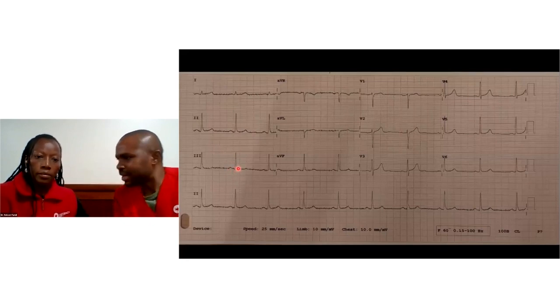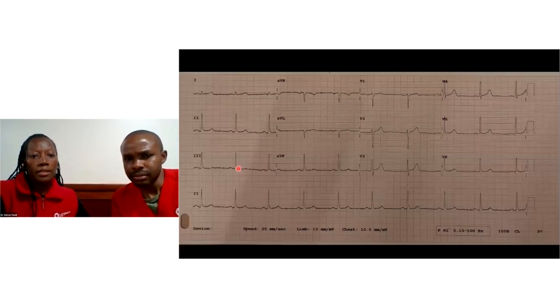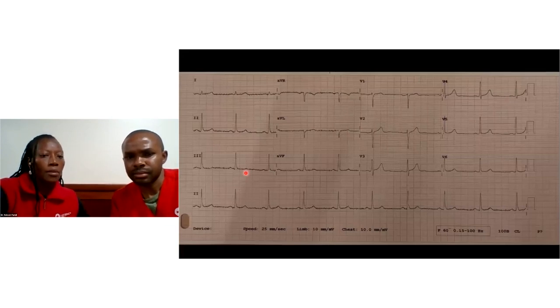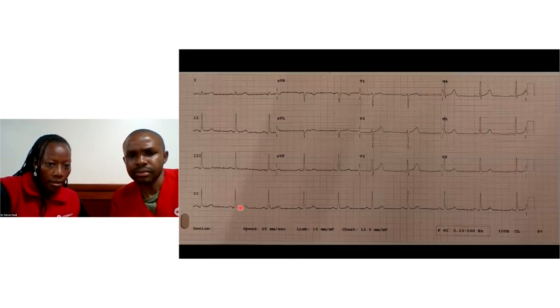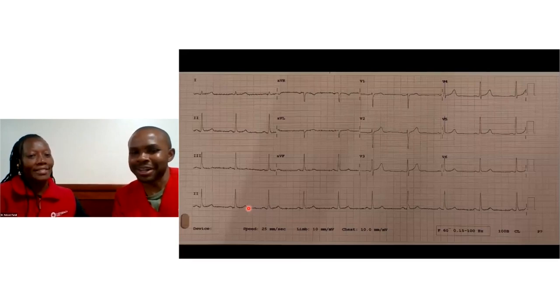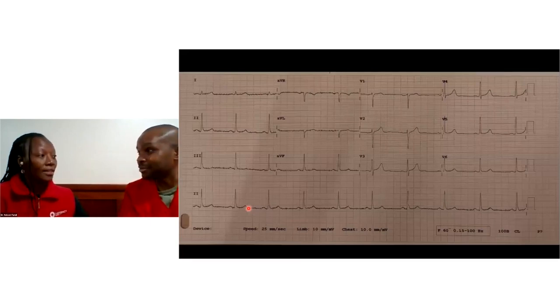And after that, do you want to tell us what next, Grace? So after that, Dr. Nelson, the myocardium will be going back to its resting phase, or what we call repolarization. And then that is how we are going to trace our T wave over here. Yes. So what you're saying is that is our P wave, that is our PR segment. We have the QRS complex, okay? And then we have our T wave. And that makes a heartbeat. And that's what makes a heartbeat, yes. The QRS, yes, the famous PQRST wave. Yes. All right.